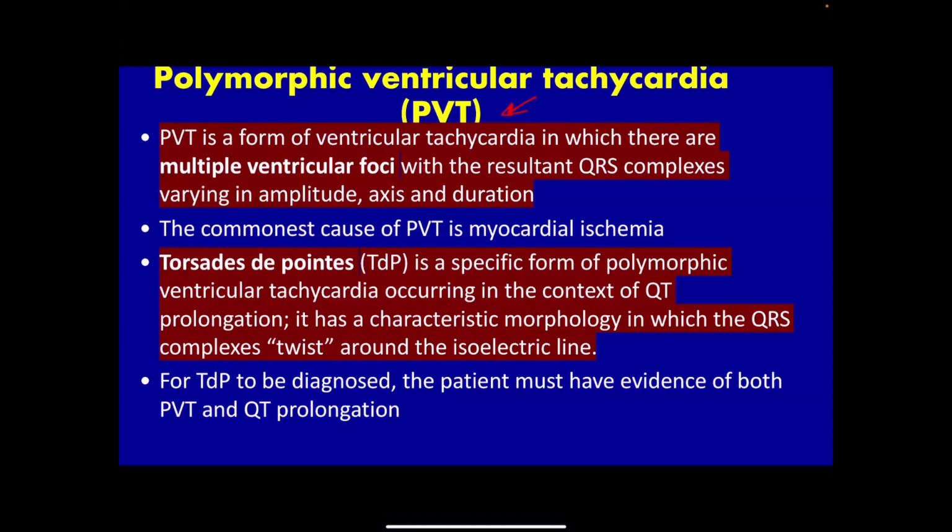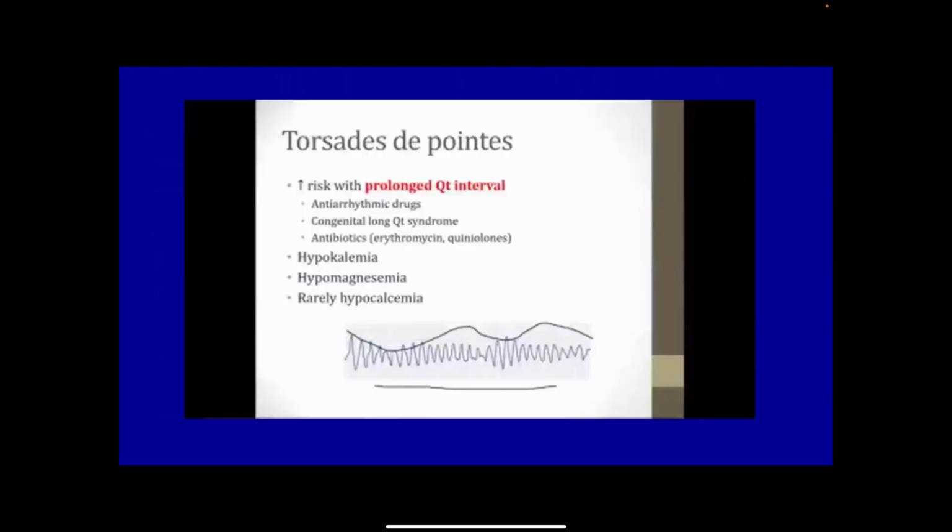Now, what you need to remember about torsade de pointes is it looks like a twist. It's as if you have a rope and you're twisting it. So that's what I want you to know. Do you see this pattern? This is torsade de pointes. It does look like VFib, I agree, but when I show you the VFib picture, you'll see a clear difference. It looks very different.